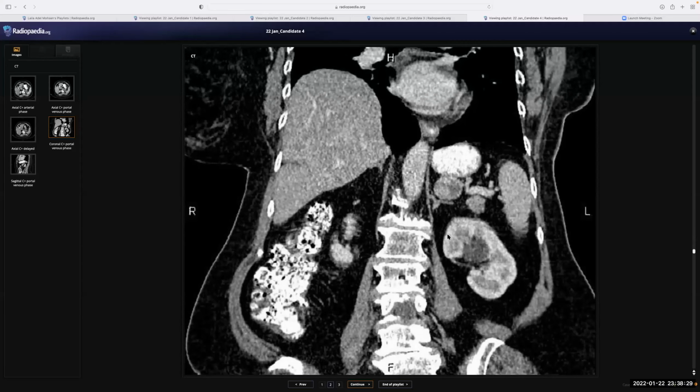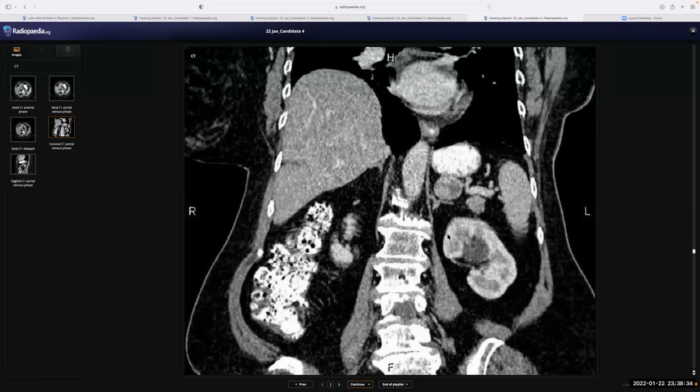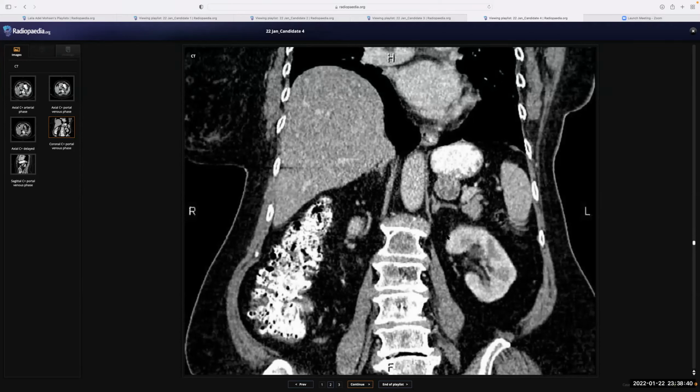And so either it can be a gastric metastasis. However, the gastric metastases are generally seen in the mucosal region. Okay, so what other possibilities? Another possibility for it could be a GIST, gastrointestinal stromal tumor, or it can be because of gastric leiomyoma.